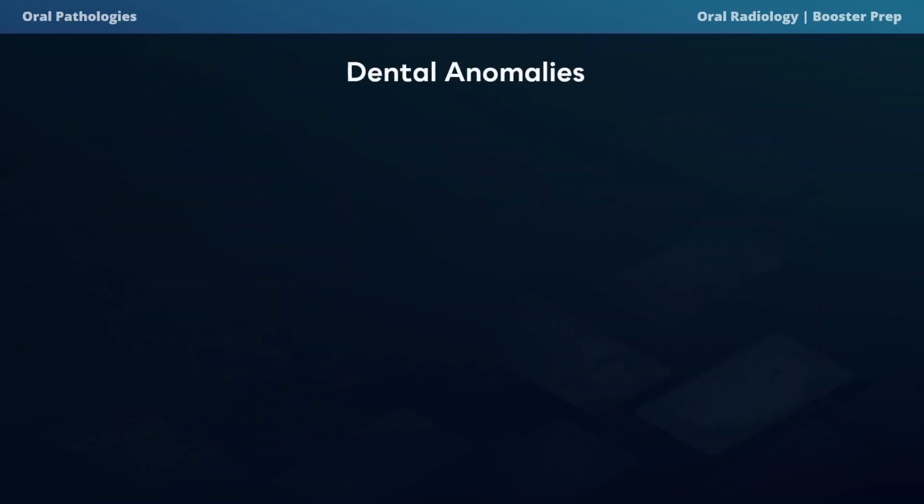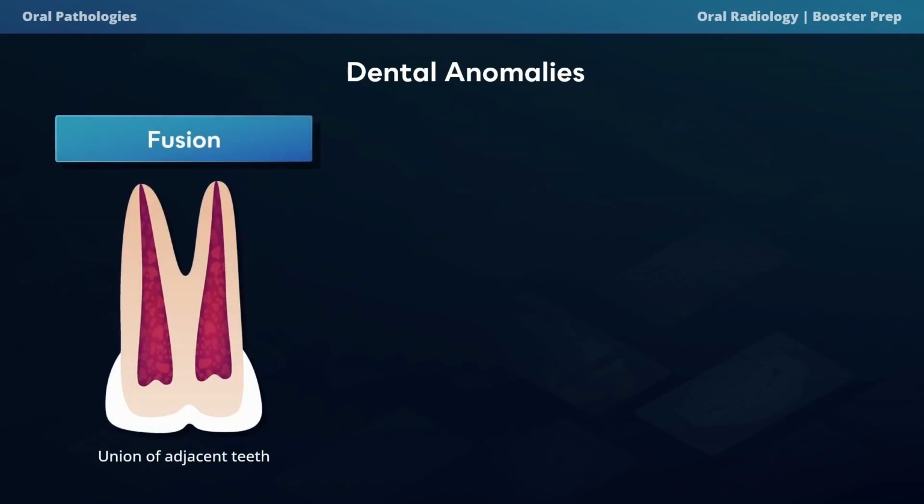Dental radiographs are also very helpful when it comes to spotting dental anomalies. They can help us identify things like conjoined teeth and differentiate between fusion, gemination, and concrescence. So fusion happens when two adjacent teeth join together at the enamel, dentin, and sometimes even the pulp, and usually it leaves one fewer tooth in the arch unless there's a supernumerary tooth involved.